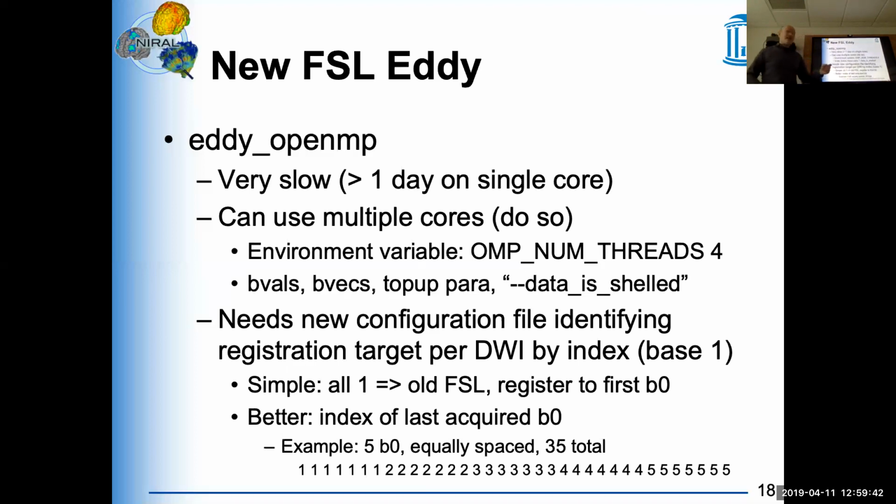If your subjects are not sedated, put a little bit of time into this, and then you don't have to worry about it afterwards. In all of this, as you can see now in the mention, both this top-up parameter file as well as this index file, if you do DTIPrep first, or if you throw out gradients first, you'll have to change this for every one of your scans.